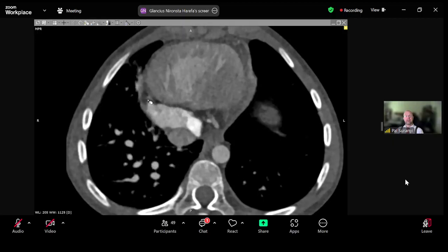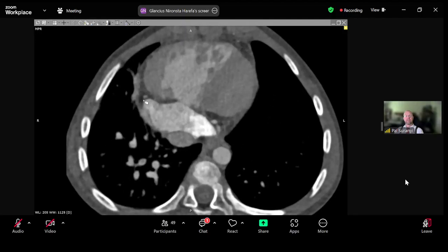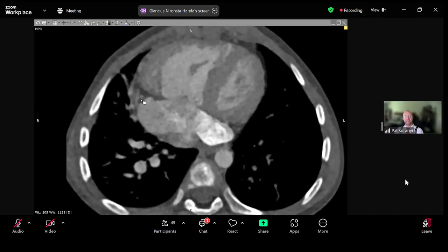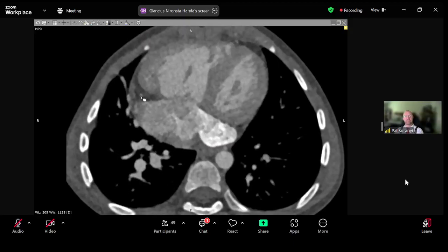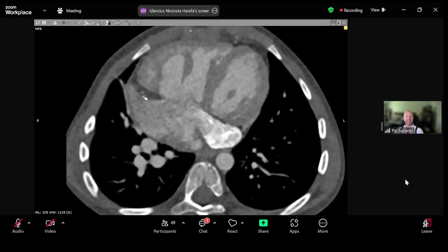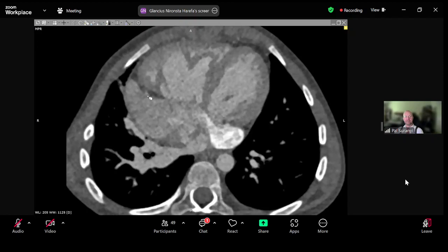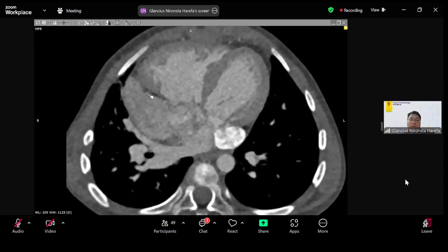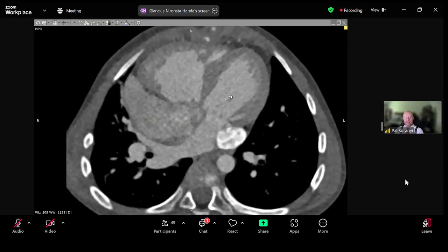And after it gave it a hug, it's going to come up in the right AV groove. It's gotta be the longest coronary artery I've ever seen in my entire career. So it should go into the Guinness Book of Records or something. Remarkable. Yeah, to this point, Professor. Yeah, very nice case. Thank you for sharing.